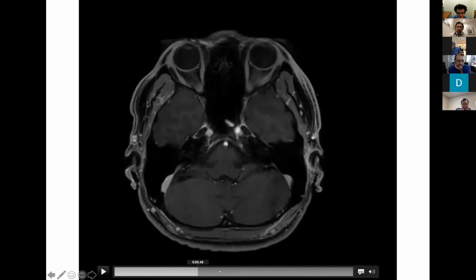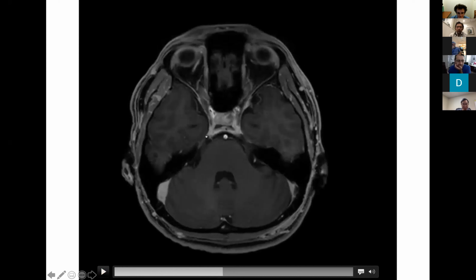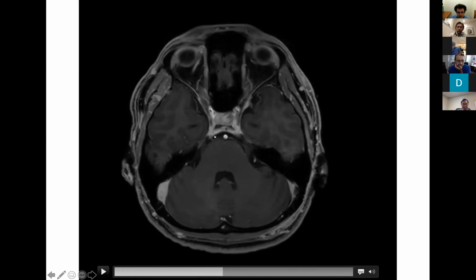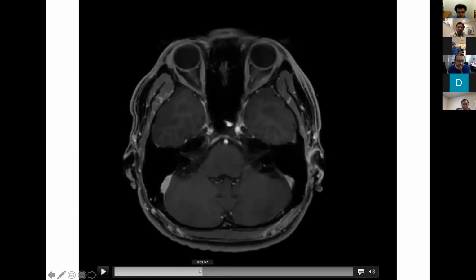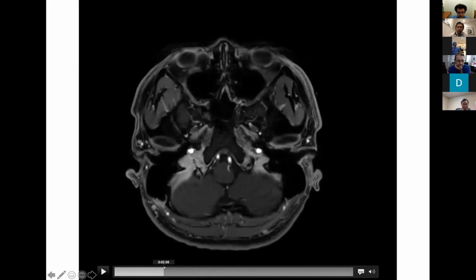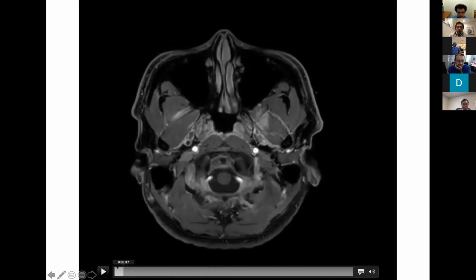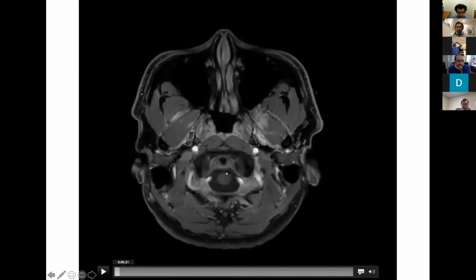When we see a vein draining into the cavernous sinus, like the bridging to the cavernous sinus or the inferior petrosal sinus, it is usually on the lateral aspect. They don't usually go into the medial aspect. I've never seen one draining into the basilar plexus.